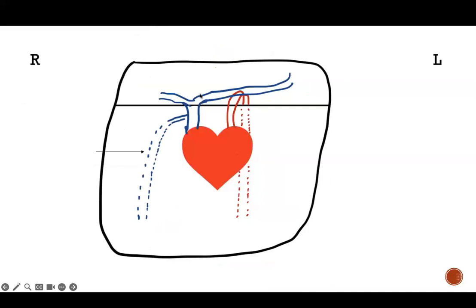So now let's talk about more veins. This vein, it's called the azygos vein. It drains the posterior aspect of the thoracic cage or the thoracic cavity. Okay, any dotted line we said is posterior, okay? So which mediastinum is the azygos vein in? Posterior. Posterior and inferior mediastinum.